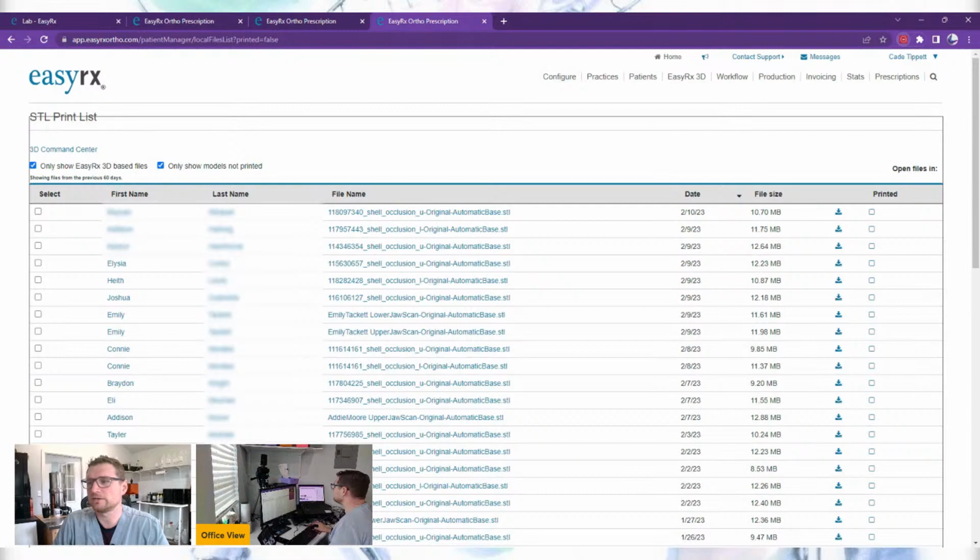All right, click off of there. Okay, come on, turn off. Love these apps. Okay. So, after you have done everything you needed to do, let's see if I can even check these? Yes, I can.